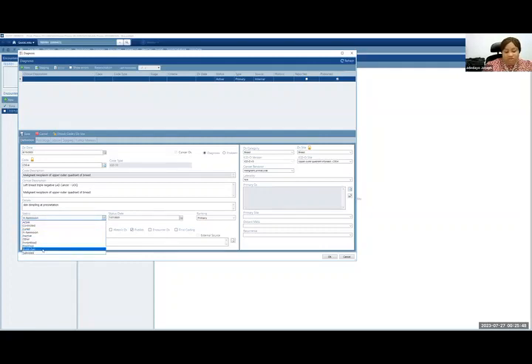It's important to select the right status in this diagnostic part, because again, it all comes down to being able to extract data for all of our uses. If we don't properly put the correct status, you will get the wrong information when you pull out the data. So again, we're going to put active here because this is still active disease. And the status date is today. So I'm saying that as at today, this is still active disease. The ranking is primary, meaning that this is the primary diagnosis. And I will explain that when we talk about malignant.